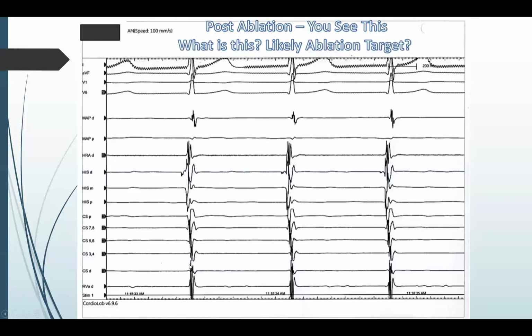And that's the reason why the A and the V are sort of on top of one another in timing. Similarly, in the coronary sinus, normally we're used to seeing an atrial and a ventricular electrogram. We're seeing the two of them smushed together because we're going down to the ventricle from the His bundle through the His-Purkinje system, and then up through the AV node back to the atrium. And so they're all sort of simultaneous. So we have established correctly that we're in junctional rhythm.